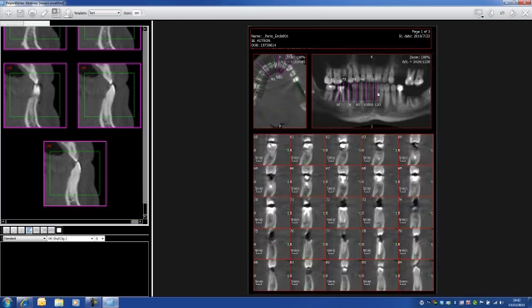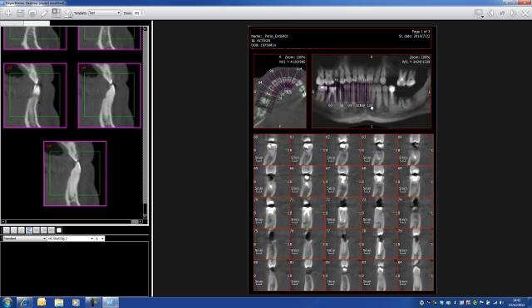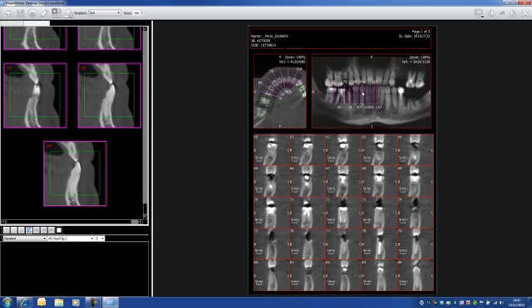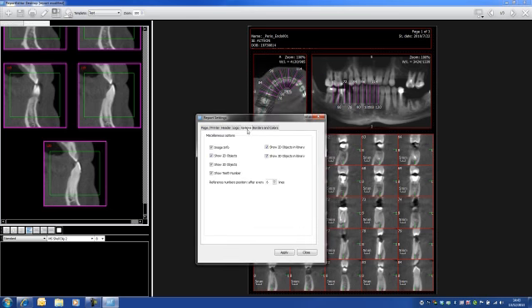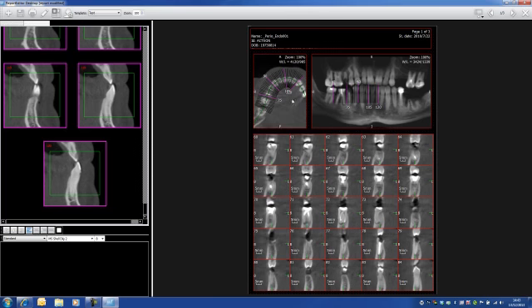with measurement on the panoramic, measurement on the arcade. You're going to tell me, yeah, but I can't see very clearly. Okay, I can just reposition the image with a click on the roller of the mouse, here the same. And if the lines are not so distant from each other, what I can do is go in setting, here, options, and then increase the reference number position. So let's say every 15. Apply and close. And there we go. Now I see my numbers a little bit clearer.